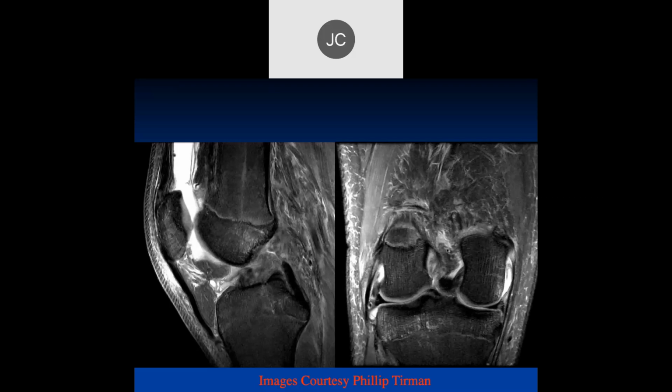All right. So I see another mid-substance ACL tear, large joint effusion, maybe some edema in that medial femoral condyle and lateral tibial plateau. Medial femoral, you mean... here's the medial femoral condyle over here, I guess. Maybe a little bit here. Sure. Okay, so here we can see a proximal and mid-substance ACL tear in this patient, right in there.